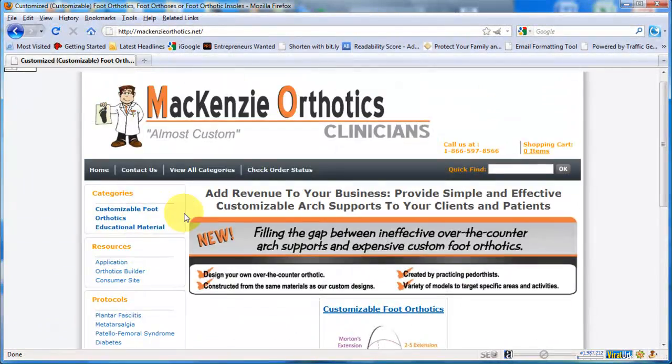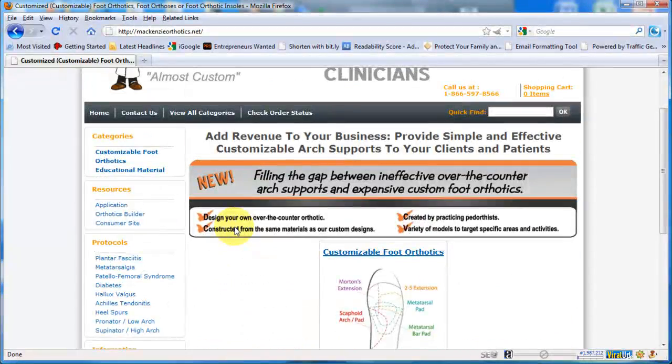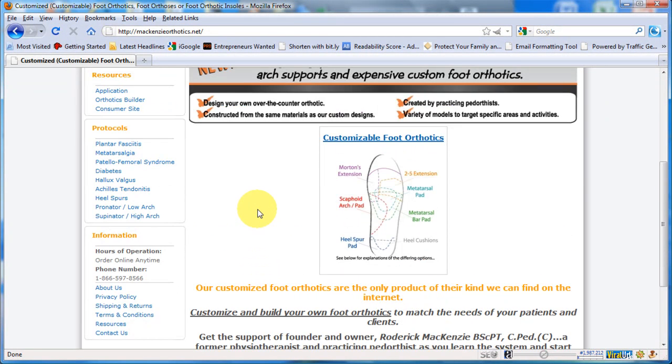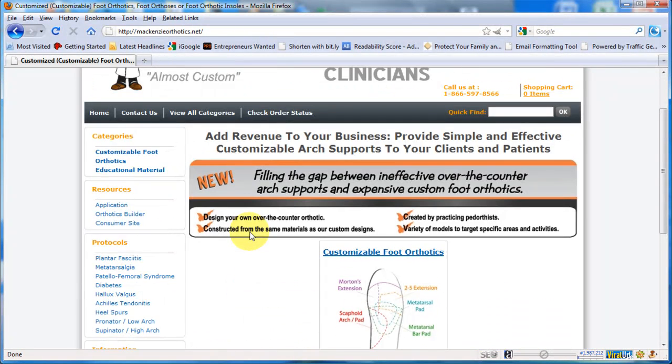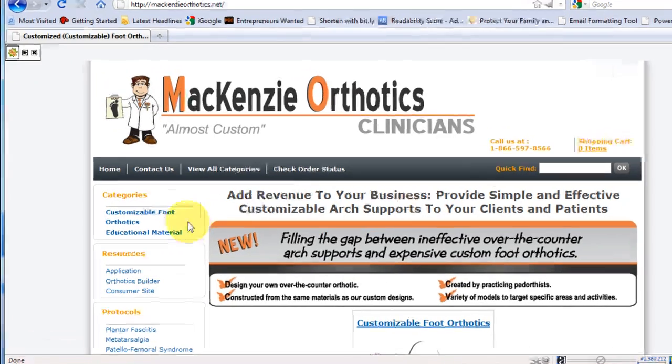Alright, so this is the front page. When you see this on the video, there may be a video in this area. I'm still working and tweaking things on this site as we go. So when you want to build an orthotic, there's a couple ways to get there.